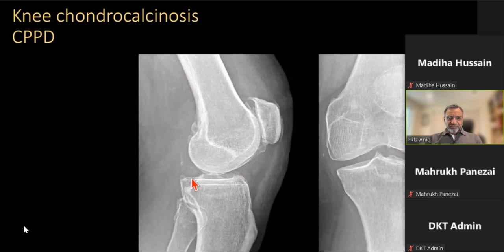There is calcification in the joint, probably partly meniscal, partly capsular, maybe some calcification of soft tissues, and the patellofemoral joint is involved, and in the suprapatellar pouch, which is a known presentation of CPPD. So you can use it as well to diagnose these conditions.